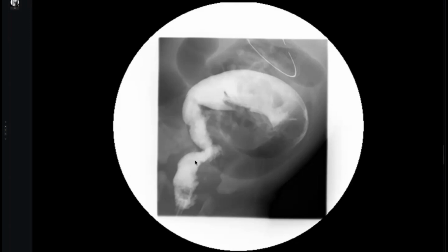Okay. What about the ratio between the rectum and the colon generally? Are you happy with this? Generally, yes. Usually, the rectum must be larger than the colon, but here it is the reverse. It is called reverse rectosigmoid ratio. Okay? So your final diagnosis?